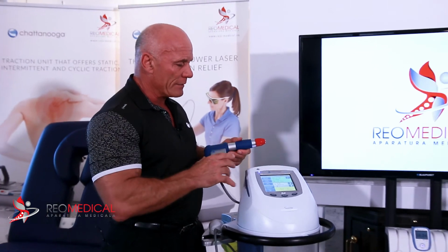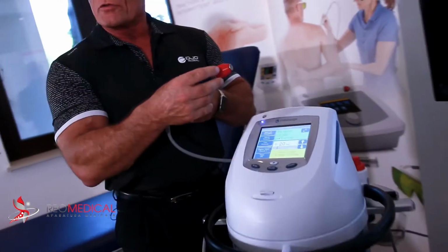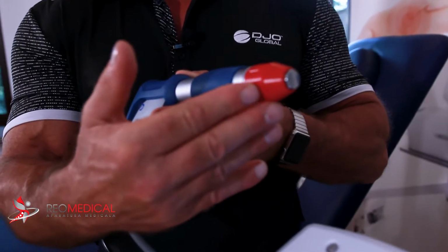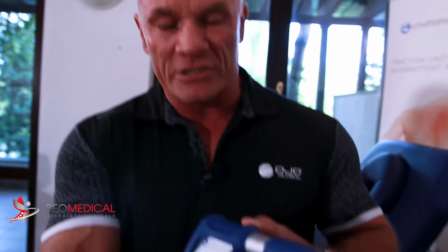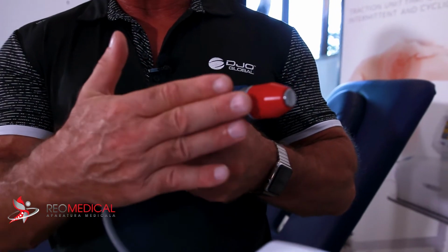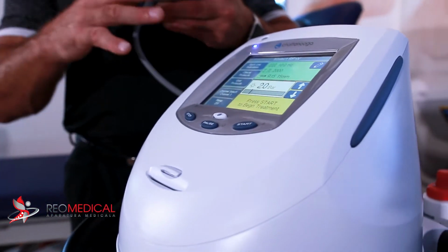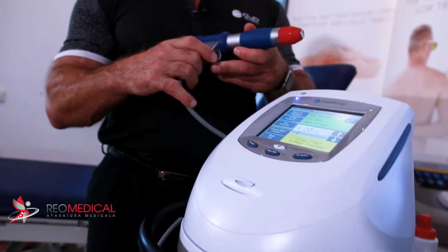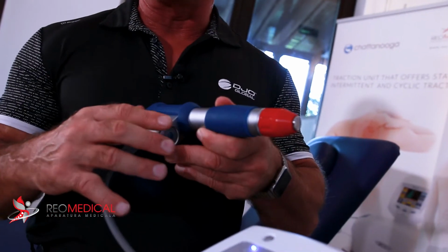Okay, so that's a very important feature to have a look at. Also, the choice, type and material of the transmitter. So the Chattanooga have 9 different transmitters available. So we can look at a cross-section of pathology and types of patients that we can treat with different amounts of energy going through the tissue.